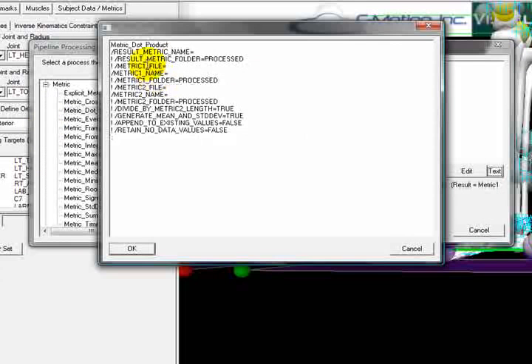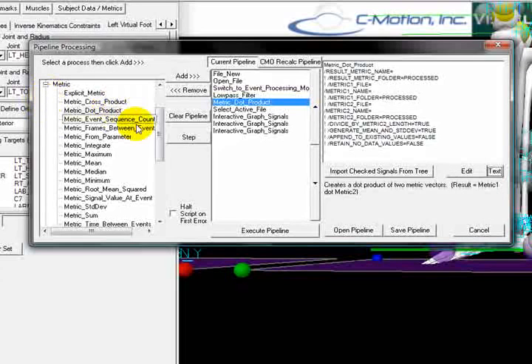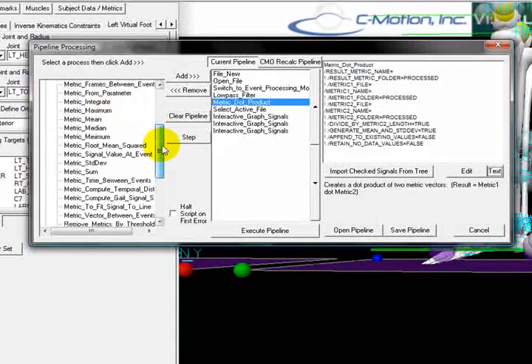As you can see, we have a large selection of commands available in the pipeline. Now we can move on to the reporting tool.